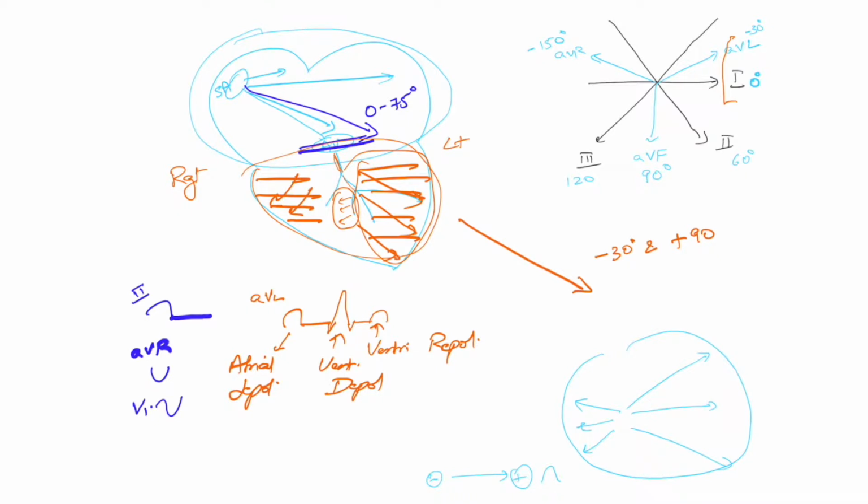What happened to the wave of atrial repolarization? Well, because the atria is not as big as the ventricle, the atria repolarize at the time the QRS complex is happening, and so the QRS complex hides the wave of atrial repolarization. Another question that comes up is, if ventricular depolarization and ventricular repolarization are opposite phenomena, why are both of those looking positive?